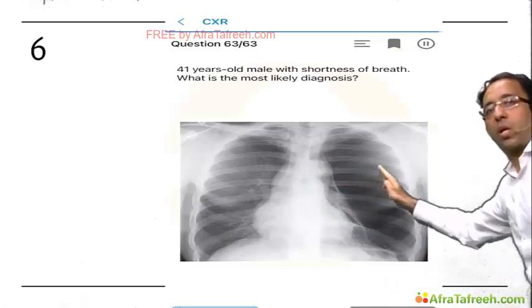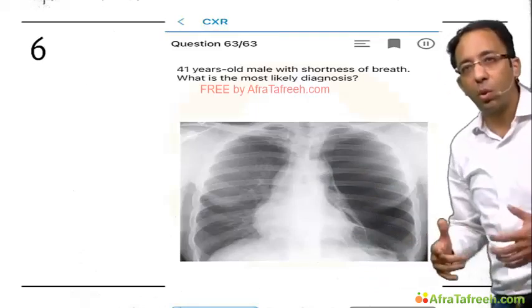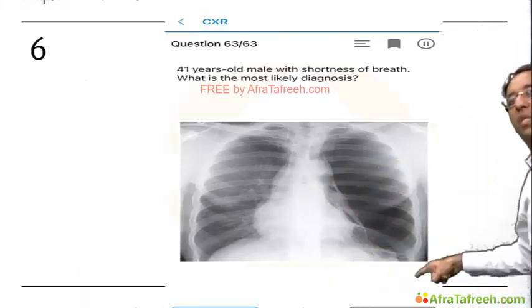Outer border ऐसा गोल नहीं है जैसा chest wall होना चाहिए था. So ये pneumothorax नहीं है. This is one of the questions from DQB I wanted to discuss in the class. This is not pneumothorax because you see that there is no obvious visceral pleural sign.